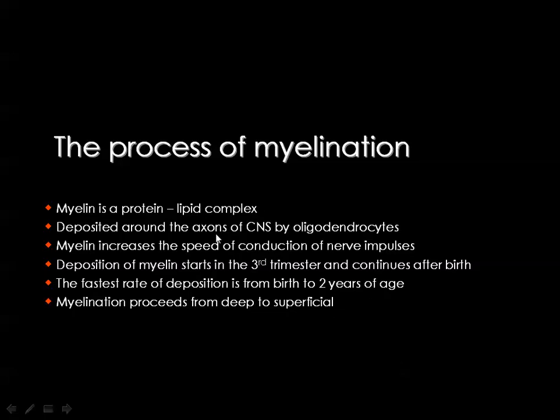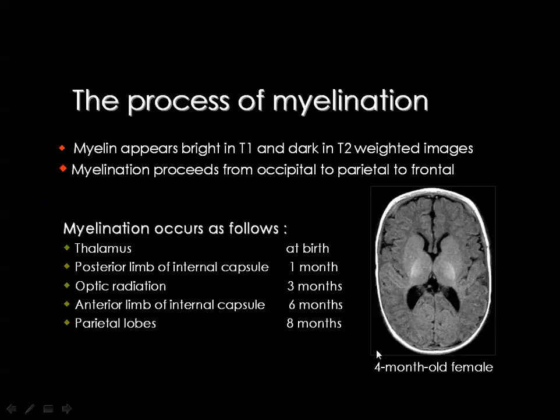And myelin, as I have mentioned, is a protein lipid complex, and it replaces water in the white matter. So the fetal brain white matter contains a lot of water, and before delivery the brain starts to deposit myelin instead of water in the white matter.